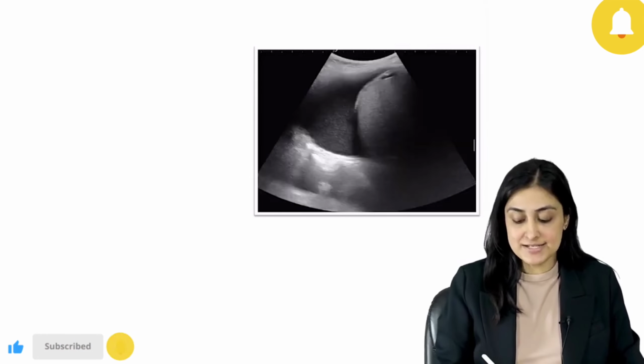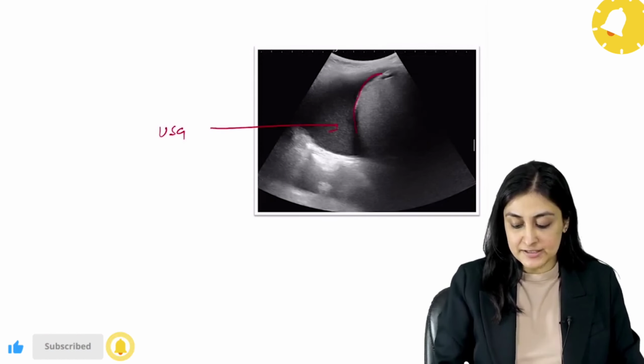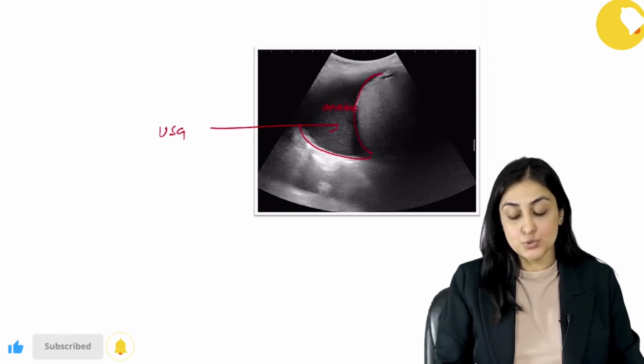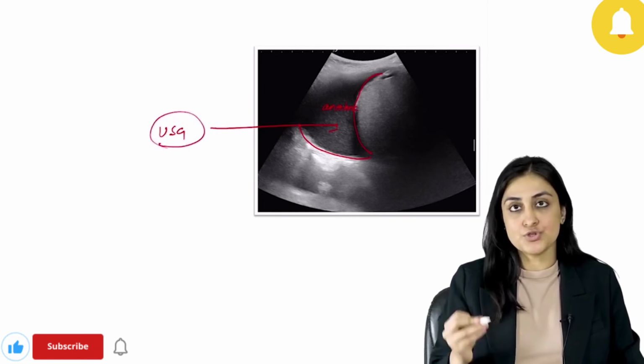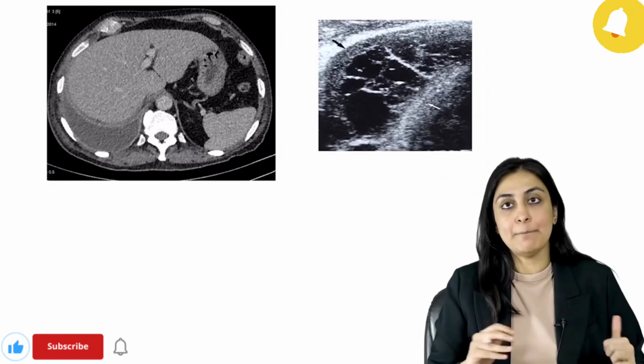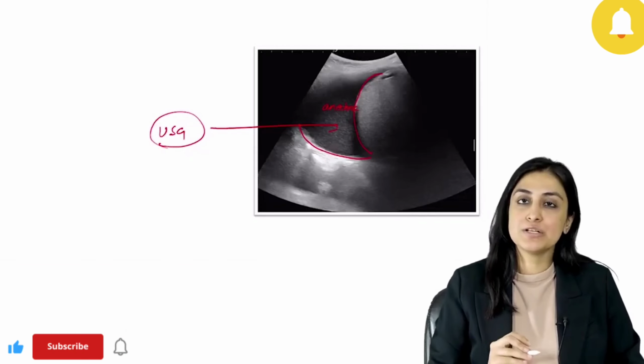When you talk about the most sensitive investigation, this is how ultrasound will show pleural effusion. So this is the liver, and you can see here that there is this anechoic fluid. So this black anechoic fluid accumulating at the angle and the pleural surface, this is how pleural effusion will appear. Going ahead, distinguishing effusion from empyema. So we just saw how anechoic, purely black effusion will appear.